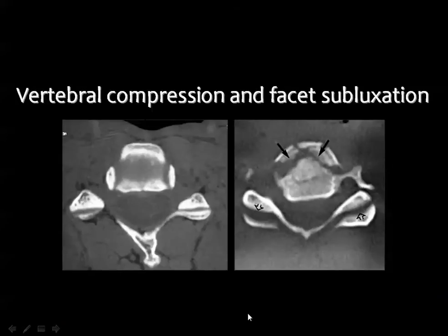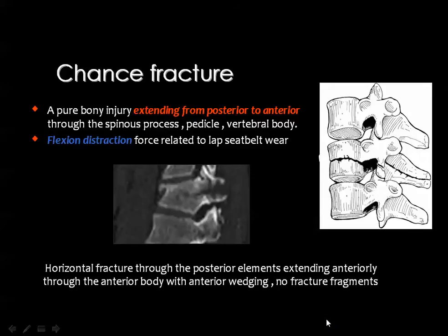Then sometimes by trauma, you get only widening of the facet joint with maintained relation of the articular facets, and this is diagnosed as facet joint subluxation.